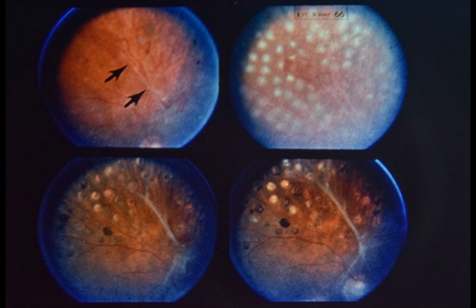Upper right, note multiple argon laser burns in photograph taken immediately after photocoagulation treatment. Lesions are scattered, 1 burn diameter apart. Note that no lesions are made directly over the intravitreal neovascularization. Lower left, in a photograph taken 4 months after treatment, note absence of retinal and vitreous hemorrhage and reduction in lumen diameter of intravitreal vessels. Lower right, in photograph taken 1 year following treatment, note further reduction in vascular component of intravitreal proliferative retinopathy.